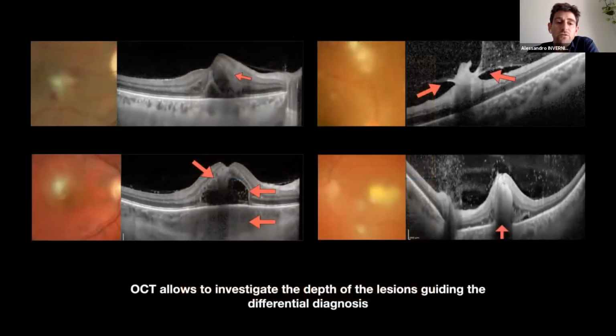So my suggestion is to perform an OCT scan across all the lesions when we are not really able to clearly understand. And of course, this is going to help us. And this I just want to show you in these 4 different cases.